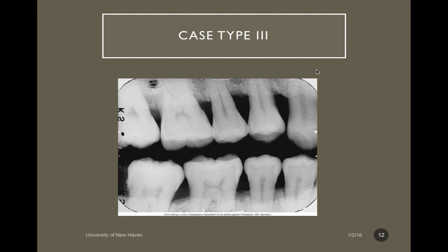Because here, if I looked between 5 and 6, I would assume this looks vertical, because this area looks more vertical than the rest of the areas of crestal bone. However, if I trace this, and then I trace from my CEJ to CEJ, this is still parallel. So this is still going to be classified as horizontal bone loss, so don't let that mess you up. It's an easy thing to make a mistake with.